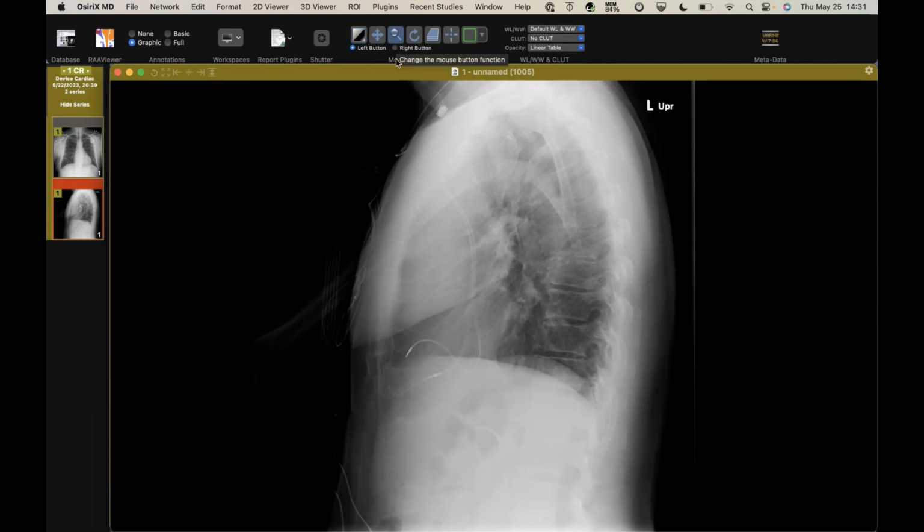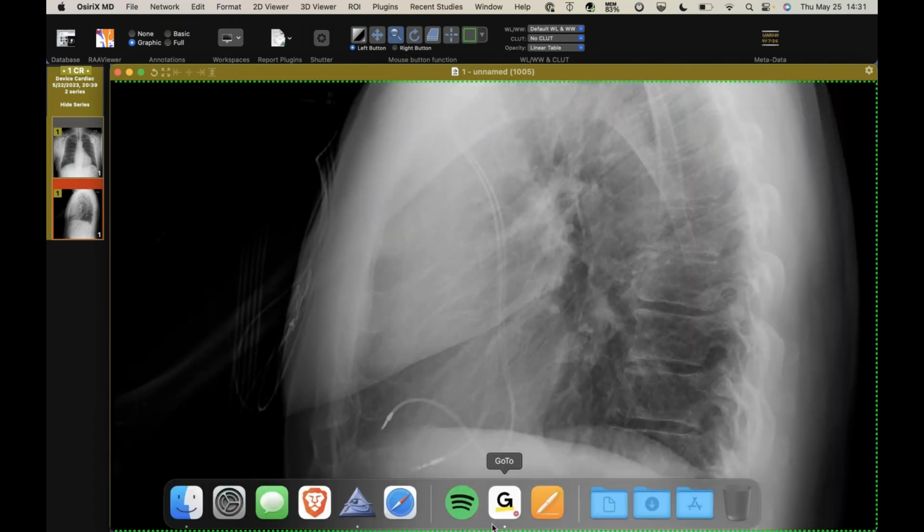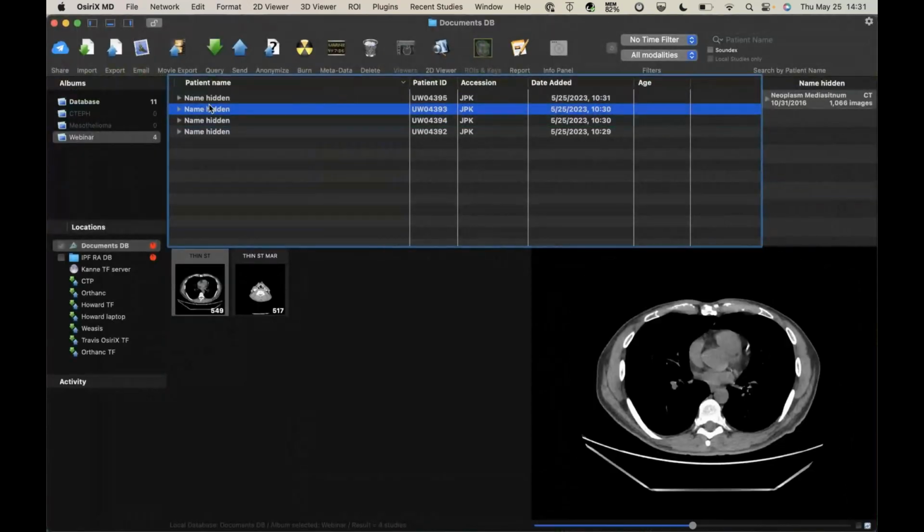Typically over here, they tell the techs and the patient, don't let anyone pull your arms down. So typically we see the arms actually just straight up on the lateral. Yeah, same at ours. But you can see that one hanging out where it's not supposed to be. Nice. Okay. And I haven't seen one of those in a while. I've seen them get dislodged, but I've not seen them the first go.